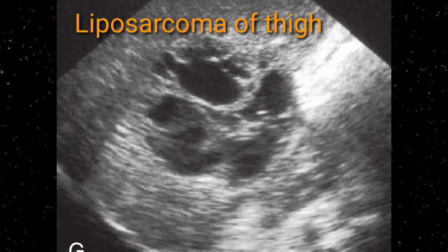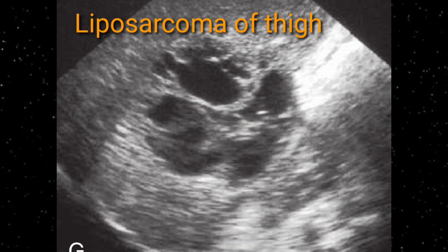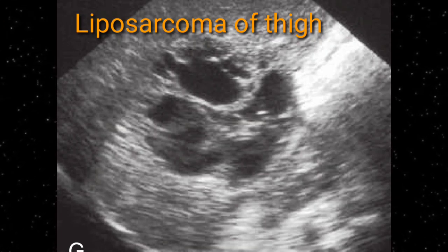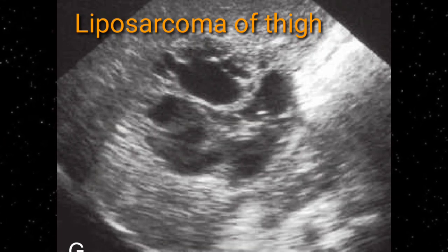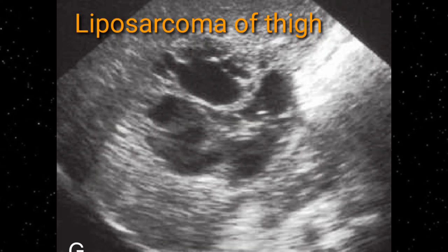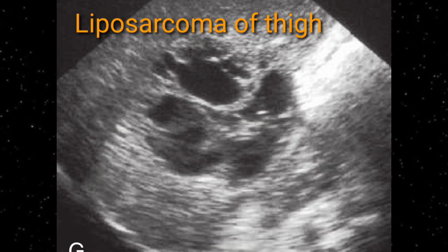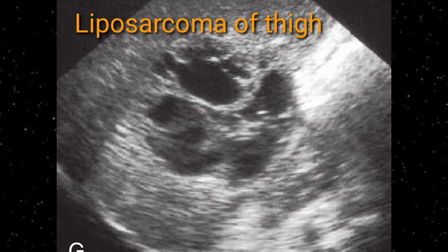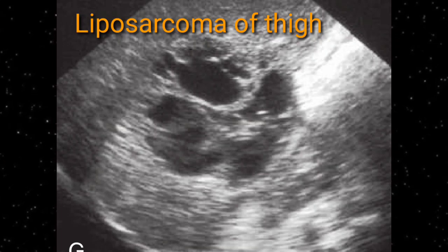Have a look, and on this image you will be able to appreciate a well-defined complex cystic lesion. You can describe it as a complex cyst with predominant cystic areas, or you can call it a multiseptate cystic lesion, or you can also describe it as a cystic lesion with solid soft tissue components. It's actually a liposarcoma involving the thigh region.